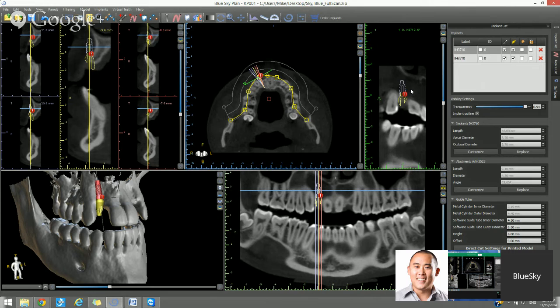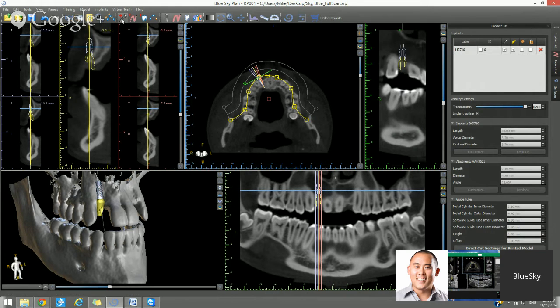Okay. Anyway, I'm going to have to check this functionality in our new build here, but what we see with the red stop sign and exclamation mark is the indication that two implants are too close together. Let's drop another implant in.